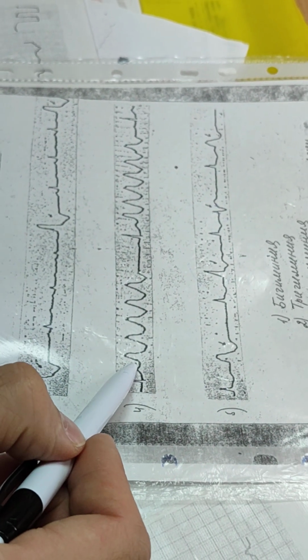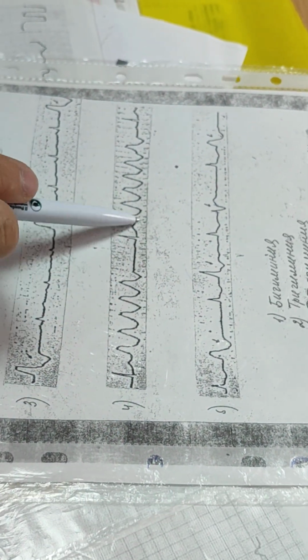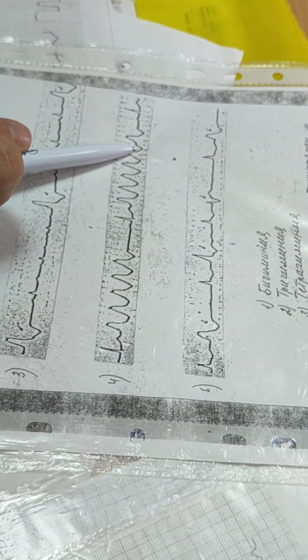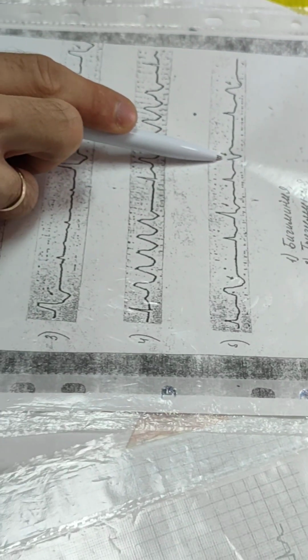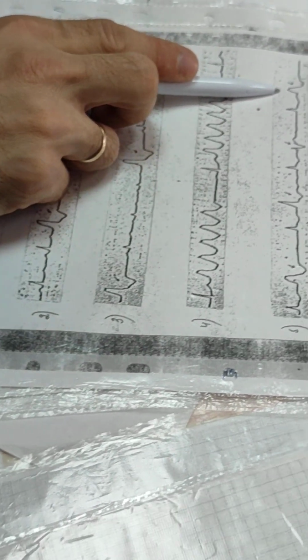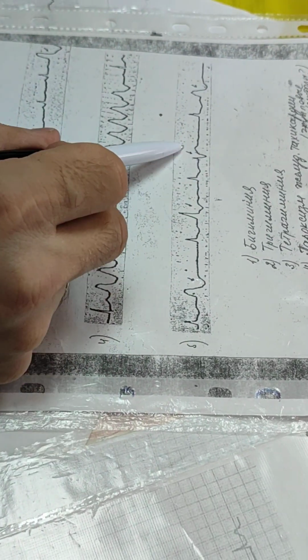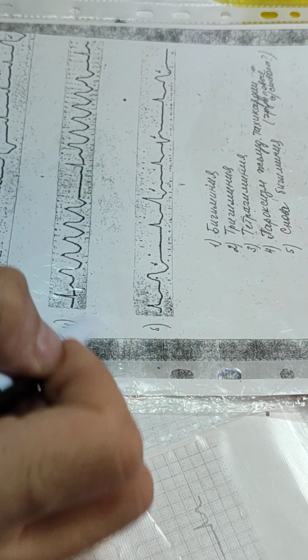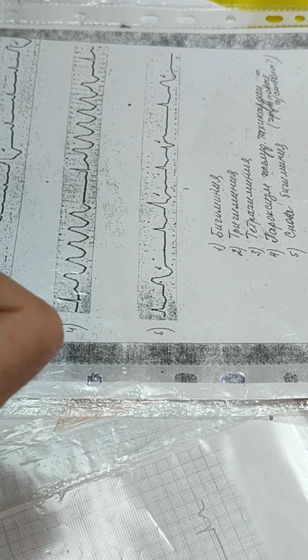It is paroxysm. In this case, paroxysm of ventricular tachycardia. Next, normal contraction and paroxysm of tachycardia again. This one, normal, abnormal, normal, abnormal, normal, abnormal. So every second is an extrasystole. It is bigeminy. But also, this complex and this and this and this are different. So it is polytopic extrasystole. There are many different areas which start to generate extrasystoles in the ventricles. That's why all complexes are different.